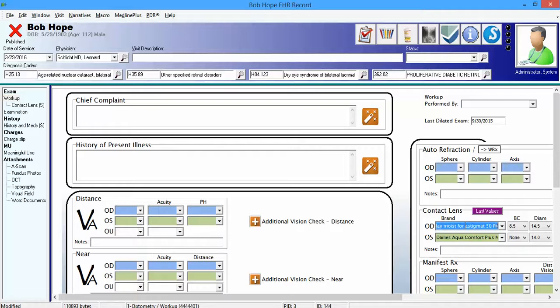If you do your documentation here, if the patient has never had a contact lens form loaded and saved on a record, you'll be just fine. These values will display on the contact lens form. Otherwise, they will be overwritten. So make sure you add that on there if you're going that route. That way you won't get your values overwritten.